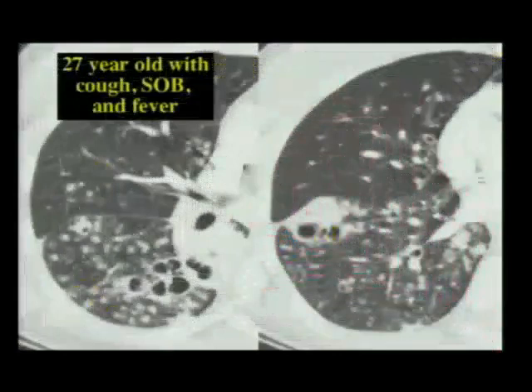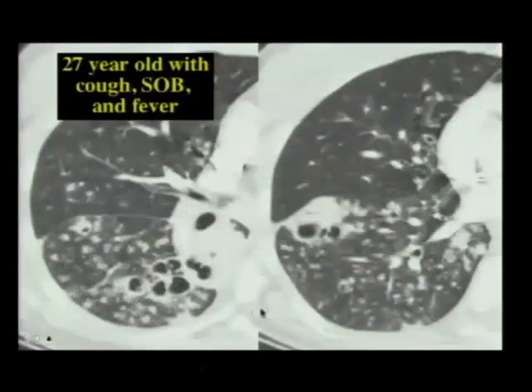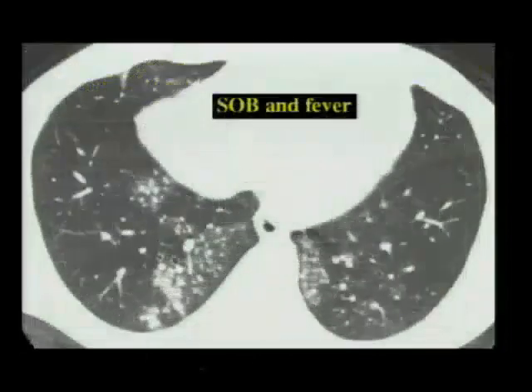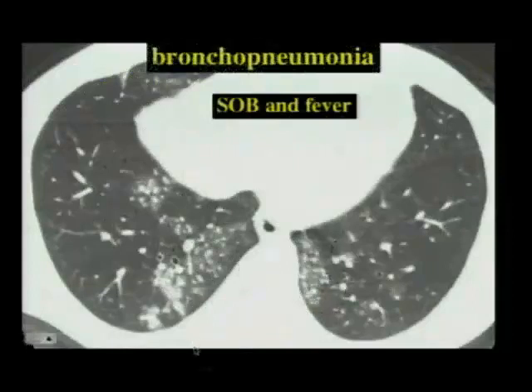Here is a 27-year-old with cough, shortness of breath, and fever. You can see some areas of cavitation in the lower lobe. In addition, multiple centrilobular nodules, the most peripheral of these centered about 5 millimeters from the pleural surface. This is endobronchial spread, multi-drug resistant TB. Here is another patient, shortness of breath and fever, a sort of patchy distribution, clusters of centrilobular nodules, again the most peripheral ones about 5 millimeters from the pleural surface: bronchopneumonia.